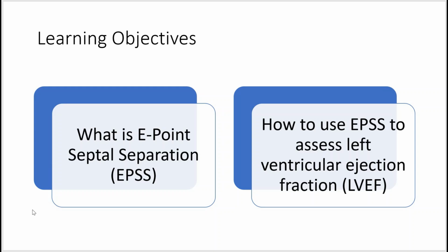So, learning objectives. We'll talk about what E-point septal separation, also known as EPSS, is, and how to use EPSS to assess left ventricular ejection fraction, also known as LVEF.